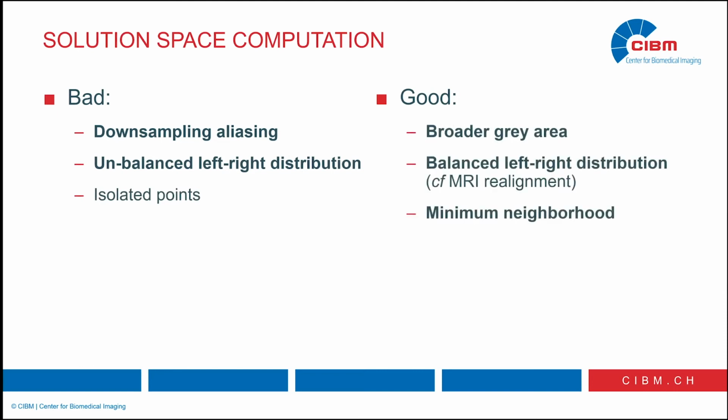And I'm just going to show a few examples. And also what we want in our specific case of inverse solution, we also wish that every solution point in the brain has at least, if memory helps, I think 6 neighbors. So you need a minimum of neighbors for each solution point. Said otherwise, you just drop the isolated point.